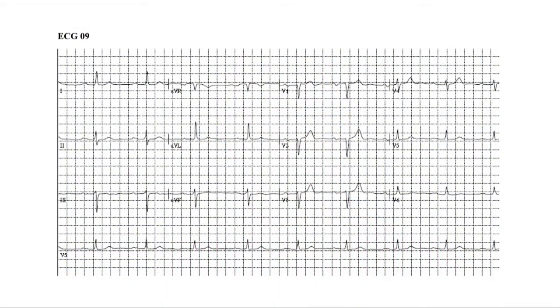Moving on to slide number 9, my suspicion is that this is a first-degree heart block. When does a GP worry about a patient whose ECG comes up looking like that? Okay, so a first-degree AV block is defined as a PR interval greater than 0.2, which is 1 big square. If it's just over 0.2 seconds or 200 milliseconds, then it really doesn't mean anything in particular.